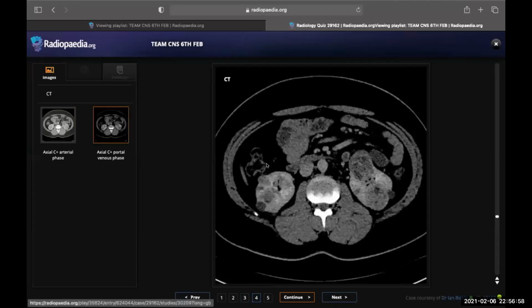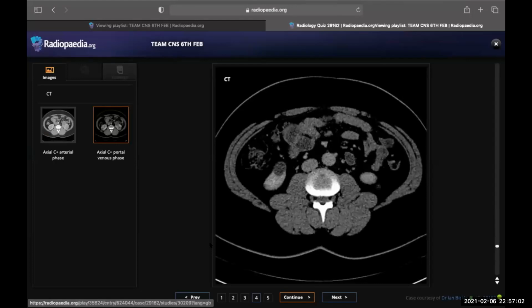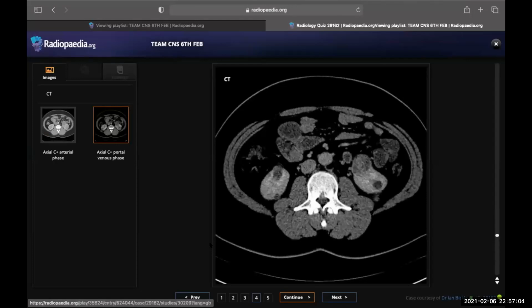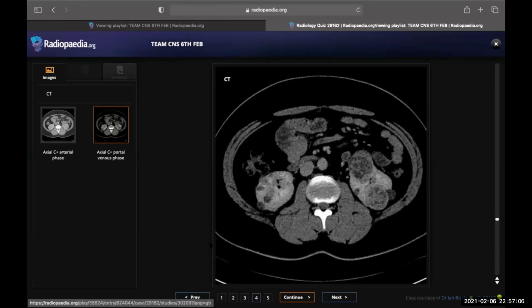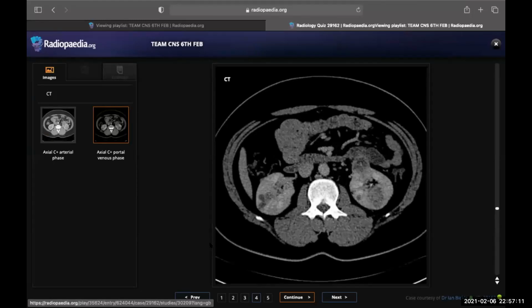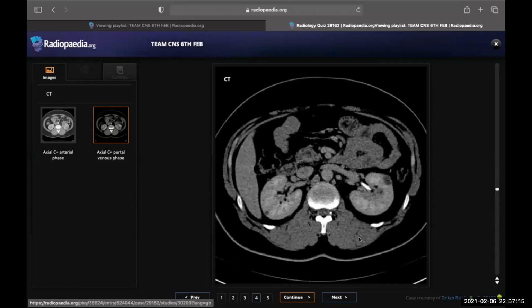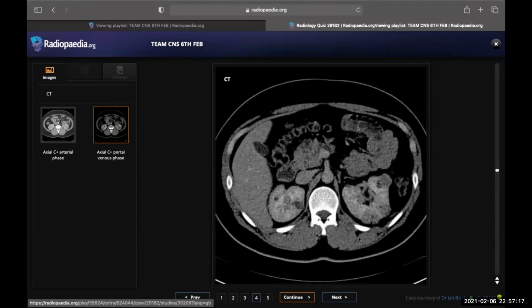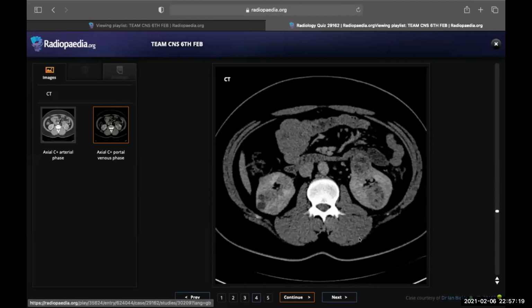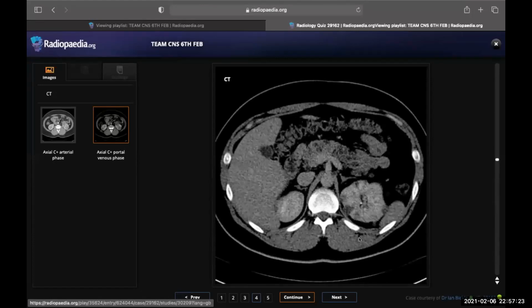Okay, I'll give you directly the portovenous phase. VHL, remember, this is not tuberous sclerosis, this is VHL. Now, give me the findings in the kidneys. Okay, multiple soft tissue lesions with heterogeneous enhancement. Excellent. This can represent RCCs. Yes, okay. And anything else in any other organ?